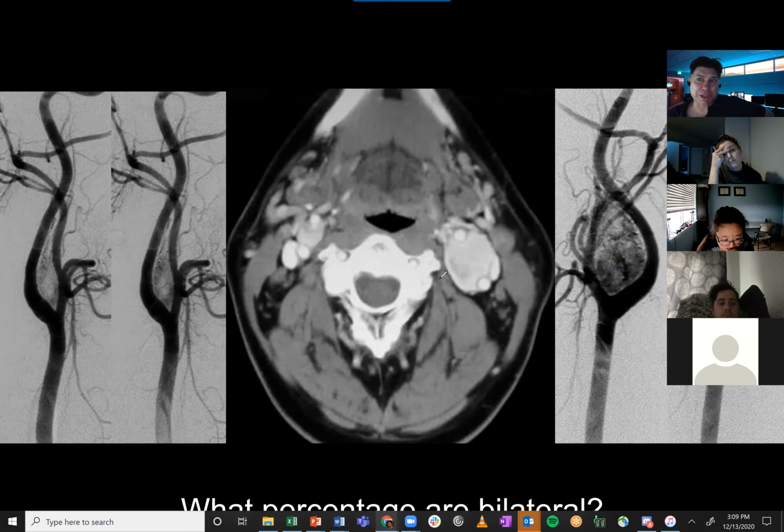Sometimes when we talk about pathology, we have important checkpoints, something we want to be sure we mention. Is there anything with a carotid body paraganglioma that you mention in your report so that the surgeons have a better idea of how they might want to treat that patient? I'm not sure. Does it have something to do with the deep lobe of the parotid gland? Well, no, this is at the carotid bifurcation. Yeah, sorry. We try to mention how far around the ICA the lesion extends.